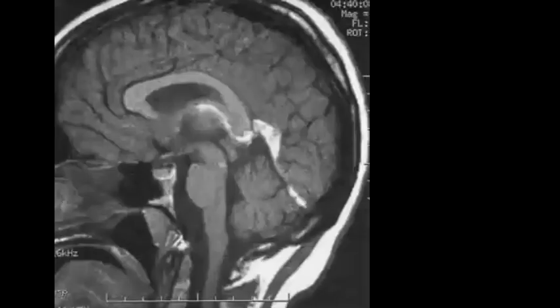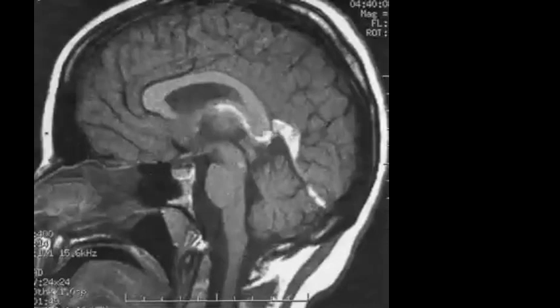But if you check, I think you like to check the sagittal image or the MRV of this patient. So the sagittal image, which is T1 signal. So the T1 signal here, you can see that there is T1 high signal, exactly. And there is T1 high signal along the straight sinus and the vein of Galen. So this proves for you that there is thrombosis.